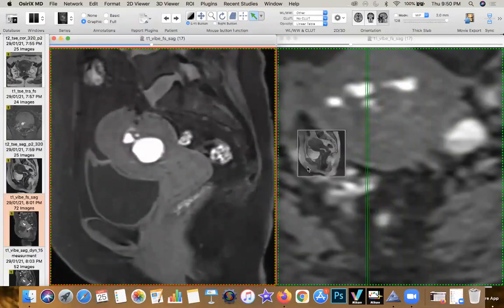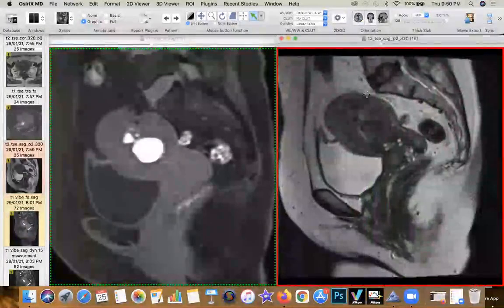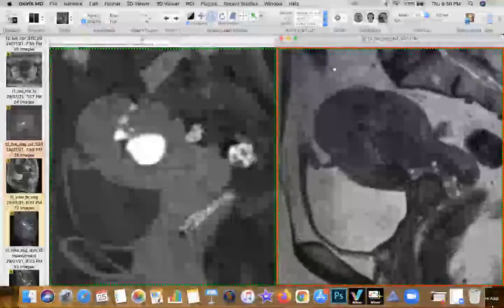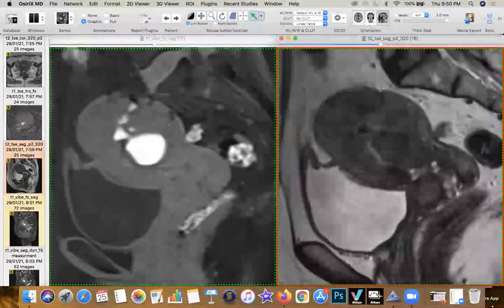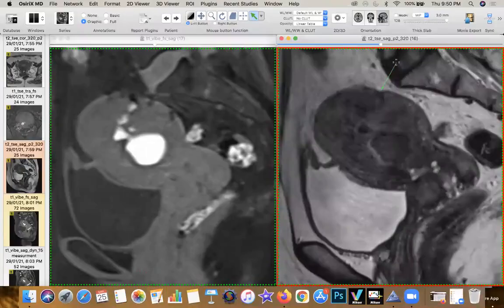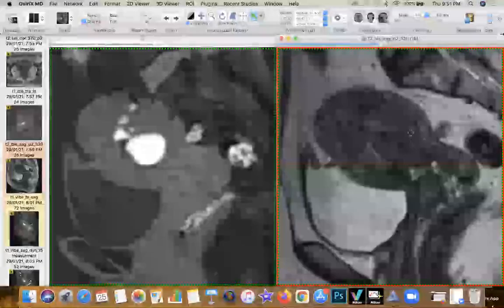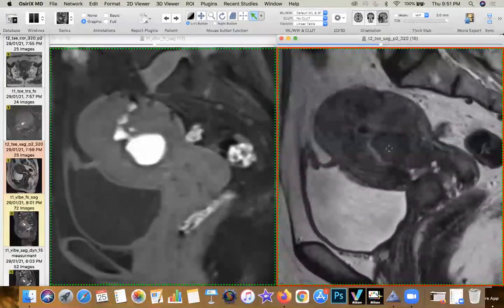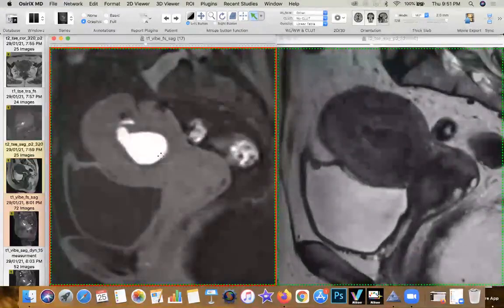Now let's go back to the T2 weighted image and kind of now make a note of what's happened. So just to kind of corroborate the same, that's the site of the surgical scar where you have the dimpling. That's the hemorrhagic lesions, which are very dark. But what is the signal intensity of that hemorrhagic lesion? Is it very bright on the T2, or is it showing something called a T2 shading? Yes, it's showing T2 shading, and it's homogeneously hyperintense on the T1 weighted image.